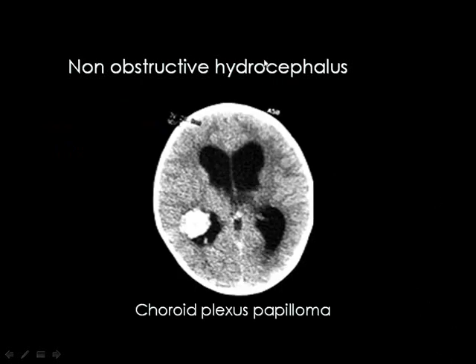Another case of a non-obstructive hydrocephalus in the occipital horn of the lateral ventricle, due to choroid plexus papilloma.